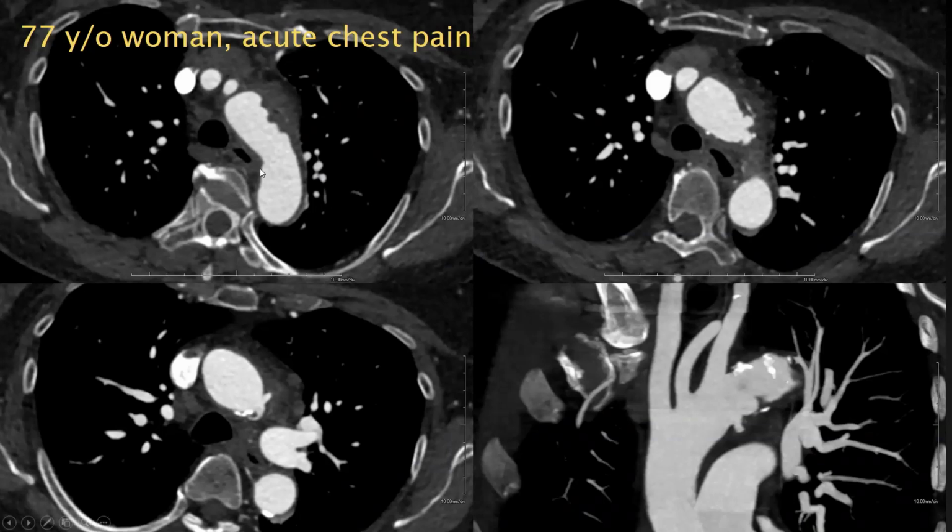And you can see here, this is just in the distal arch, because here's the innominate, the carotid. So the subclavian comes up here. So this is on the undersurface of the arch. First, you see a lot of atherosclerotic plaques. This is hypodense. I didn't show the non-contrast now, but even on the non-contrast, this was low in attenuation. So this is plaque on the luminal side. This is thick atherosclerosis in the patient's aortic arch.